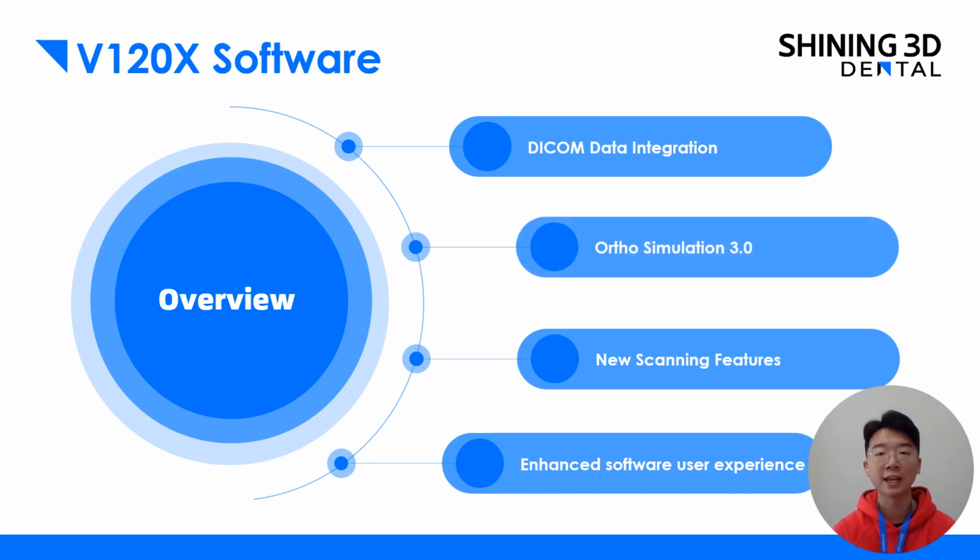So that's the end of part 1, DICOM data integration. Now we will enter part 2, Ortho Simulation 3.0. We will not only give you an introduction about the new updated features, but also the Ortho Simulation as a whole as well.